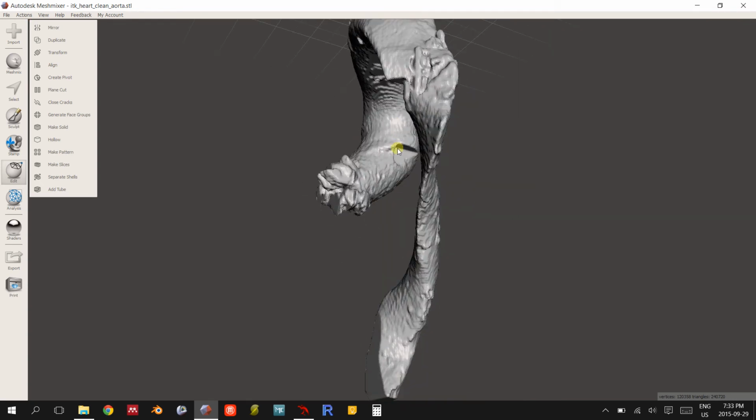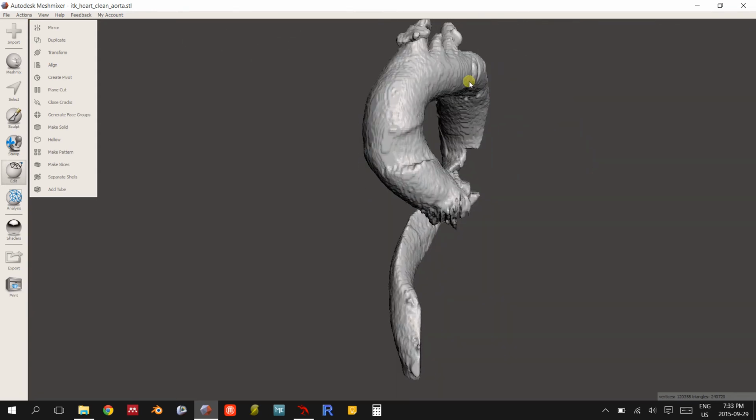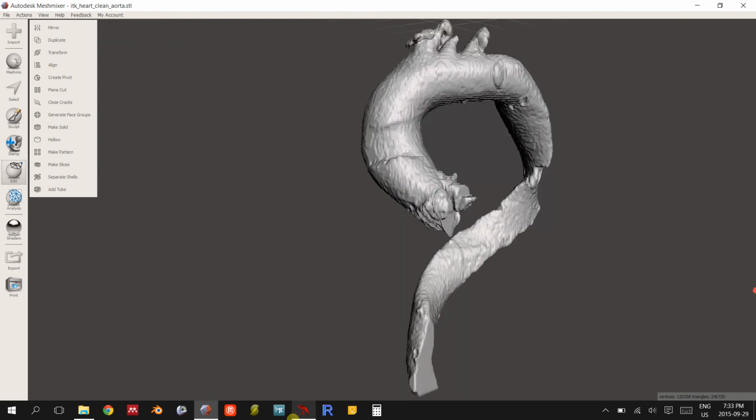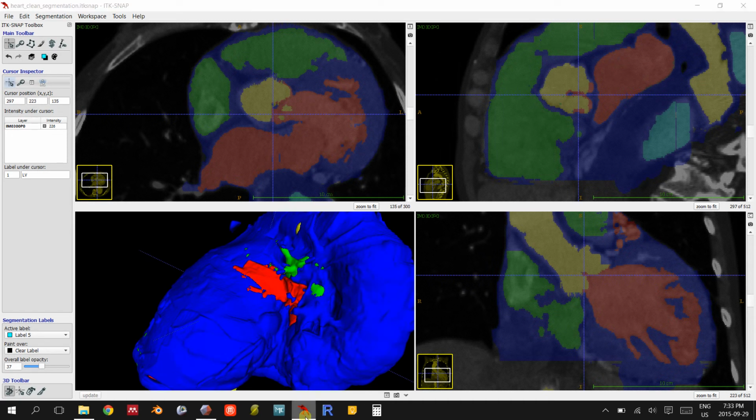Some limitations, of course, you see some strange 90-degree angles here. That's a problem with the automatic segmentation, and it gets kind of hard to find these really, really small spots of imperfections once you're dealing with a model of this size and this far covered. But we'll work on it. So it's a work in progress.